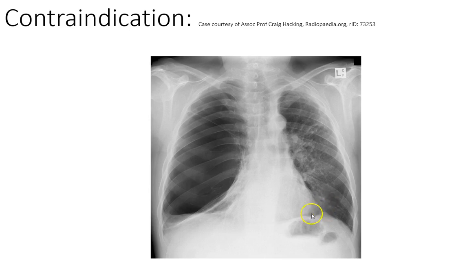So that's tenting of the hemidiaphragm. Okay. The next thing I'm noticing, so the heart is about the right size and it's in about the right position. You notice I'm deliberately not going to the big, impactful thing we can all see yet, because it's really important to make sure you take everything on board on a film and don't deviate from that.